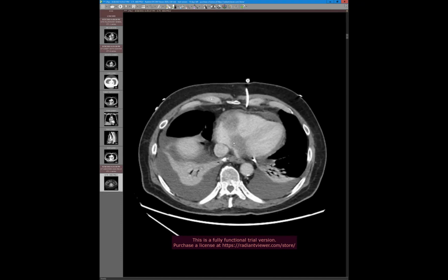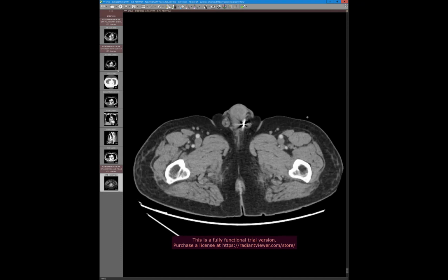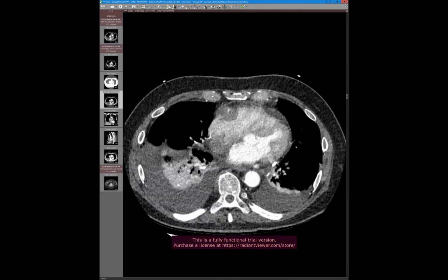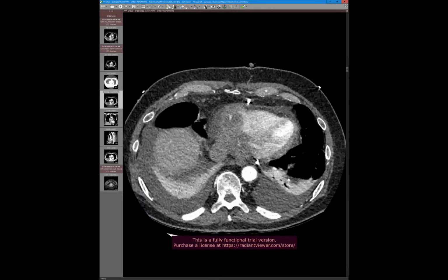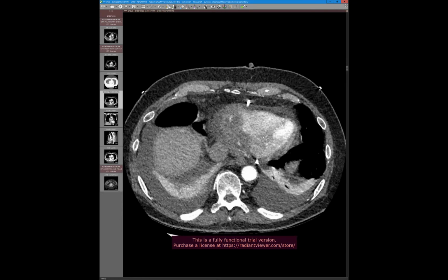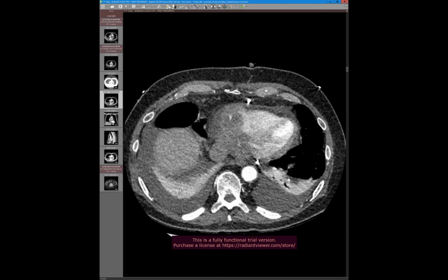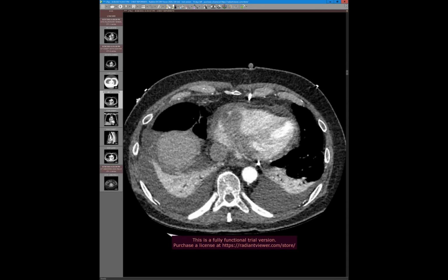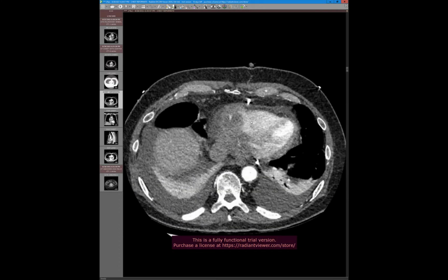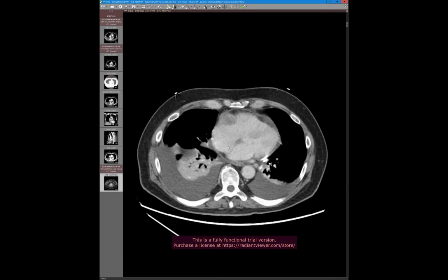Anyways, so this was, a lot of people might say, oh, it's AV groove, this is going to be angiosarcoma, but you can notice angiosarcoma doesn't usually have this infiltrative pattern growing along the underlying scaffolding of the heart. So whenever you see a tumor infiltrating along the scaffolding of the heart, you should immediately think of lymphoma, which this was.